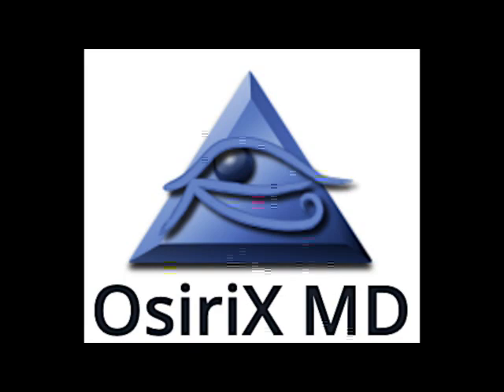This OsiriX is meant for post-study manipulation of the imaging provided by the CT scan and MRI and other imaging modalities. This is a post-study manipulation of the thin series or the basic series the machine produced, and we manipulate this thin series to get more information about the anatomy of certain lesions.